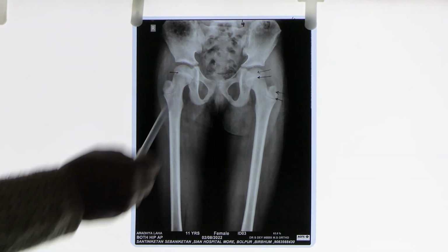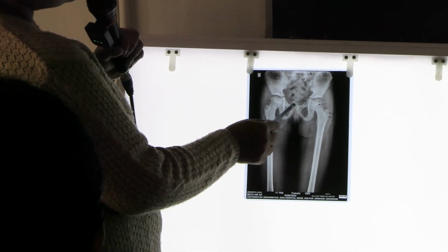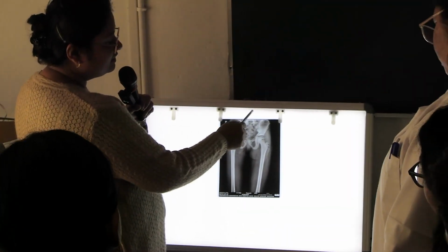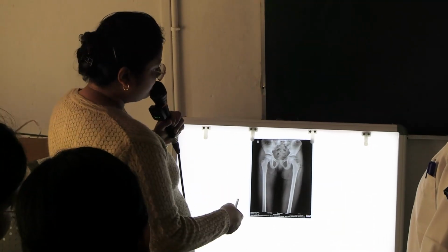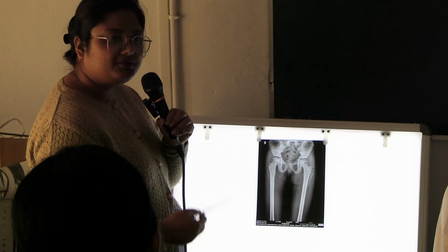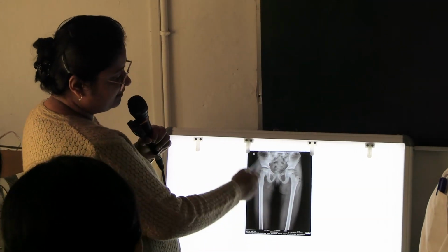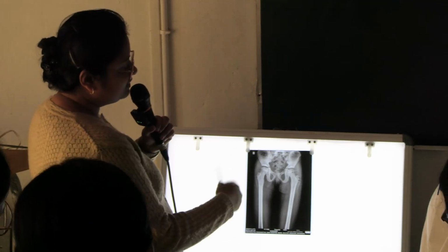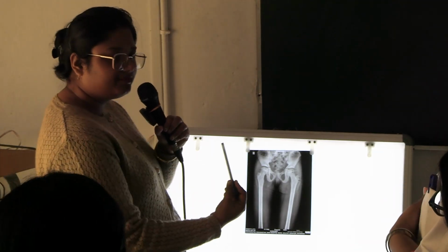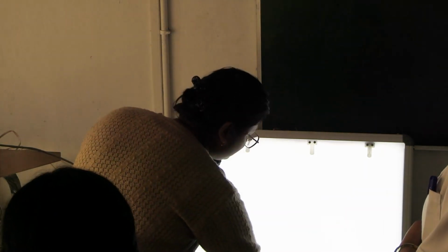Okay, like this. These are the obturator foramina, ilium, ischium, pubis, symphysis pubis. This is sacrum, and above will be the lumbar vertebrae. And here also you can see ilium, ischium, and pubis also have not fused with each other. Okay, and this is the shaft of the femur you can see. So X-ray of the pelvis showing all these structures, AP view. Okay, and plain X-ray.